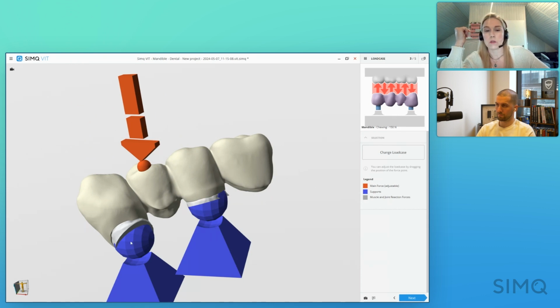And in this workflow, these are where the supports are. So this is the anchoring, and this is how the simulation is applied. So the force down here, and then this is the base, because you have to apply force on a fixed space. Otherwise, it can't, physics. So you just click next.